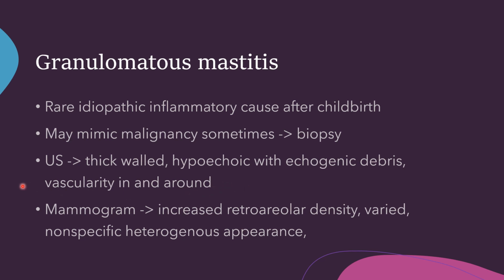If you go down for mammogram, you would see increased retroareolar density. Again, this is just one of the presentations. There are a wide array of different presentations you can see on mammogram, and it can have really non-specific heterogeneous appearance too.